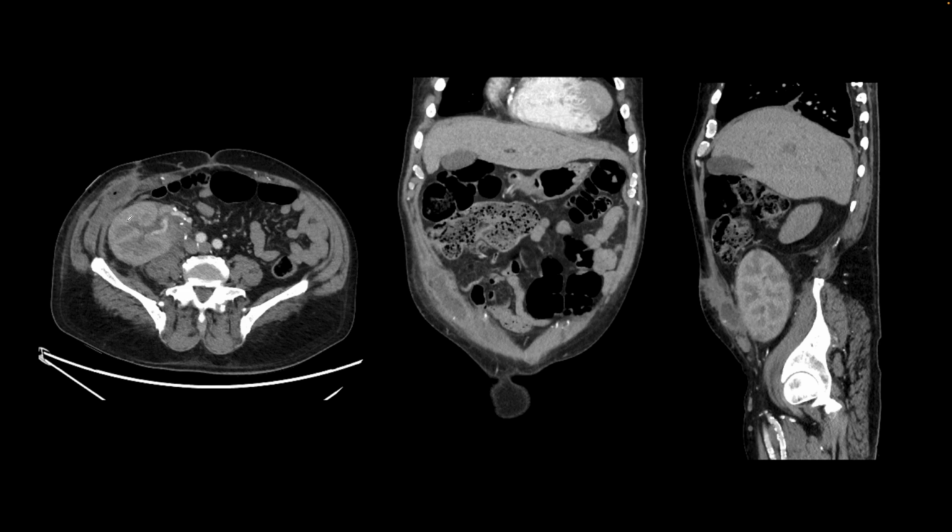This is our next patient. They received a renal transplant in the right lower quadrant. So this is the transplanted kidney. That transplanted kidney shows multiple areas of cortical hypoenhancement. And so that suggests that they have acute pyelonephritis. Also, as a complication of the surgery, there is an abscess formation. We can see there is fluid, a focus of air, and thick peripheral rim enhancement. So acute pyelonephritis, which is most likely an infection that is coming from the urethra, bladder, up the ureter to involve the kidney, and a complication from surgery, which is abscess formation.